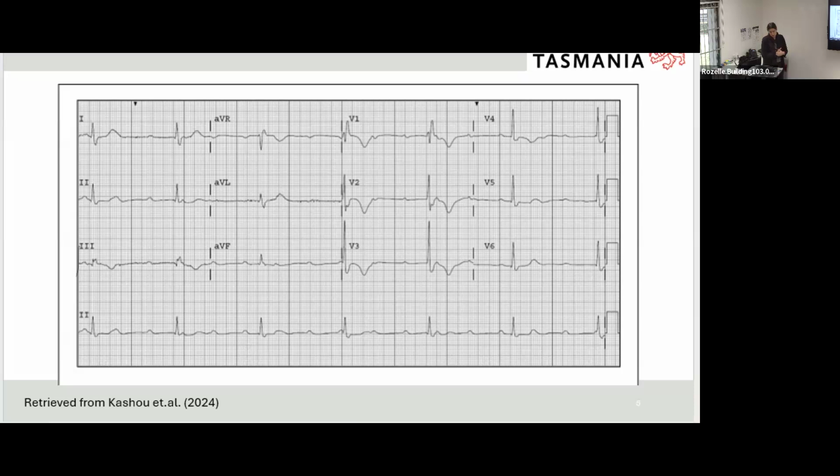All right, so beyond axis, what about our P waves? What do our P waves look like? Peaked. Normal. How would we determine if they're normal or not? What are we looking for? Yeah, present, upright, rounded, similar shapes, so coming from one pacemaker.